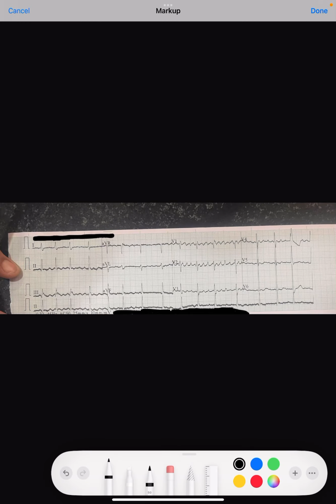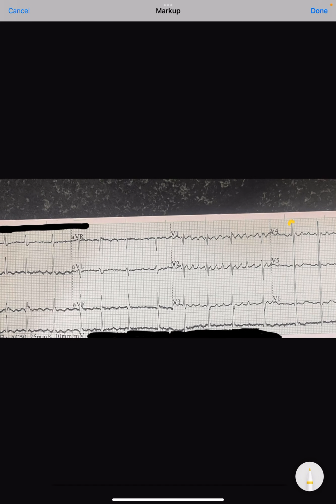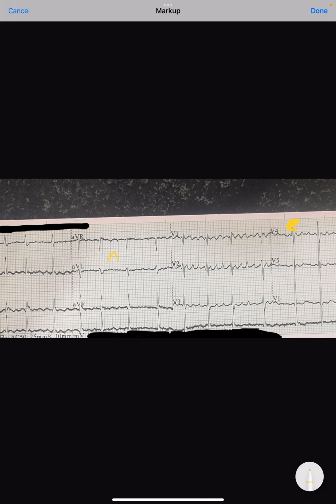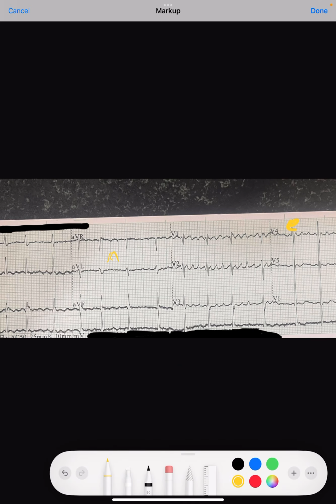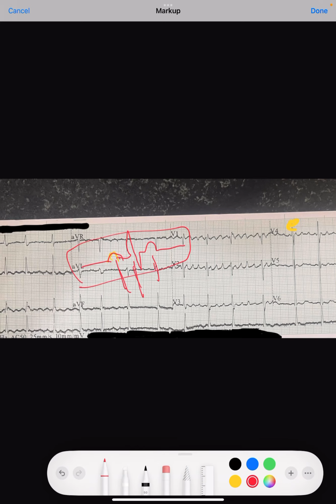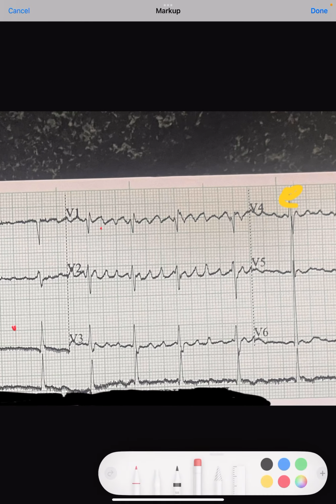Now we can pause the video and you can try to find out what is the problem in this ECG. Now when we see very closely, we always know that a P wave should be followed by a very nice QRS, and then it should be followed by a T wave, and that's all. The same pattern should be followed: a P, QRS, T, P, QRS, T. This should be the pattern that should always be followed. But in this case, what is happening?